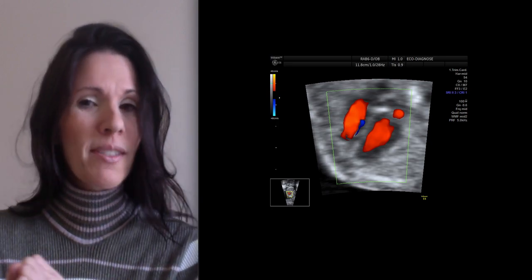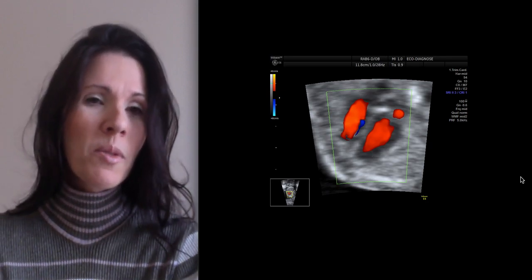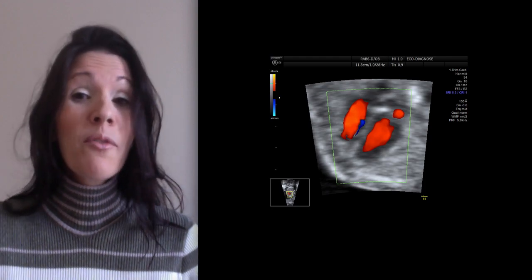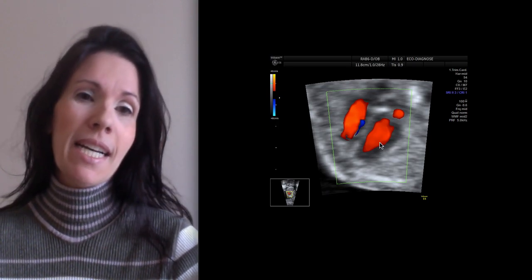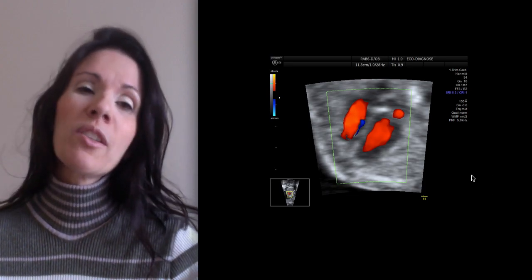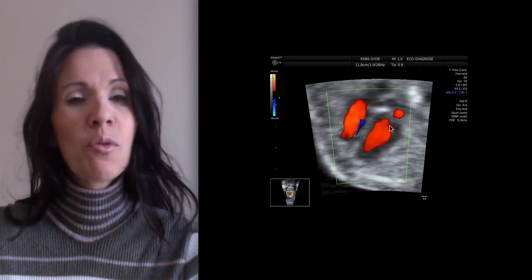And I had just two options. Because to increase the left chambers, you can have a persistent left superior vena cava, but only if you don't have the roof, because otherwise the blood will stay on this side, not go to the other side. And even septum primum ASD, where you have the flow through from right to left side.